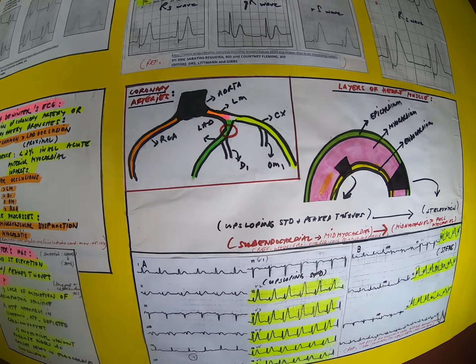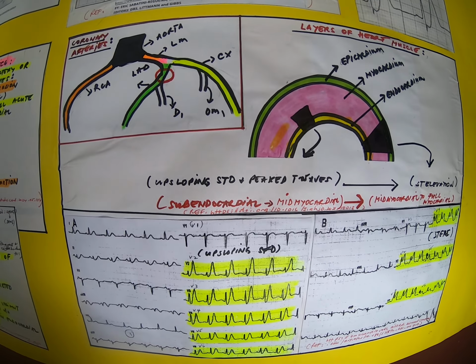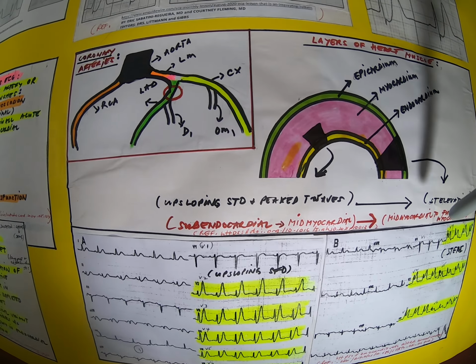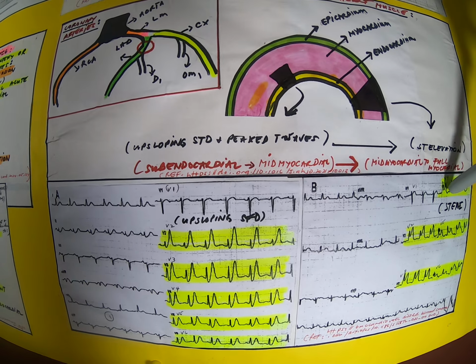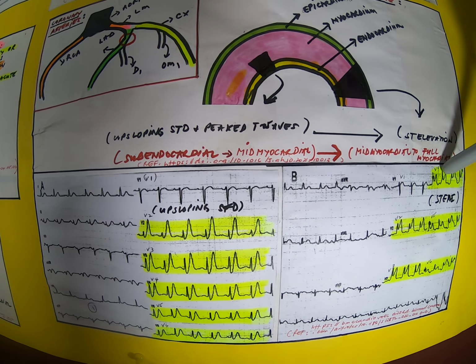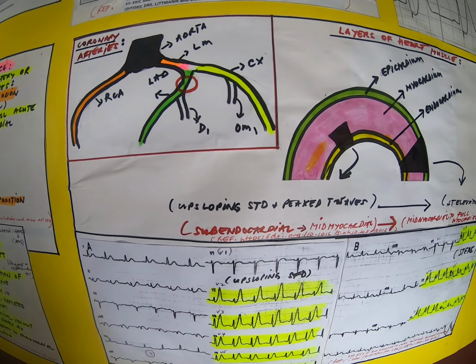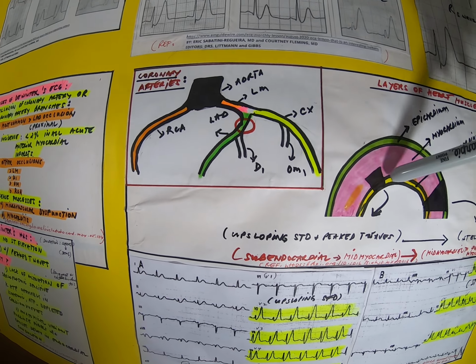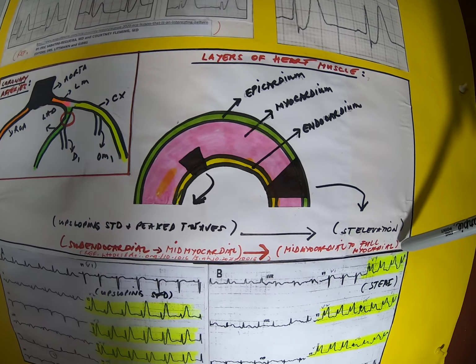Okay, and then because the duration is short and nothing has been done, because nobody knows, or maybe a doctor knows, but the doctor is not the one you're speaking with. So let's say the patient was brought late to the hospital and is still having that severe chest pain. And this is what you see. We have now ST elevation in those leads. So suddenly they went STEMI, because with the duration so short, it will end up as STEMI. So from de Winter's, which penetrated to the mid-myocardium or partially to the myocardium, to the full myocardial muscle, now they will have a STEMI.